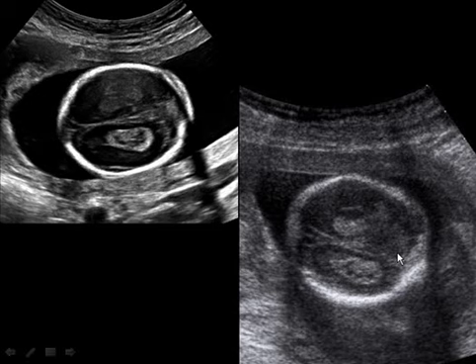Compare those discrete black circles to these 2 fetuses who have a more smudgy, irregular, ill-defined sort of blackness throughout the choroid plexus, but no discrete, well-defined sphere on either one. These have been termed the spongy choroid, but a spongy choroid is a normal choroid. It does not need to be put into the report, and this head and this head are both normal.